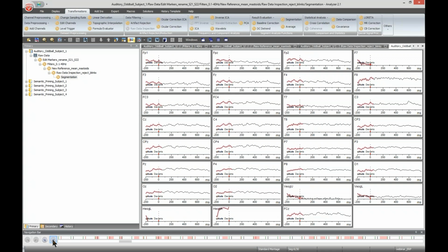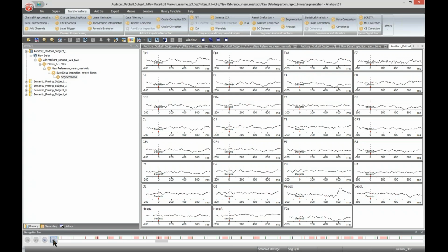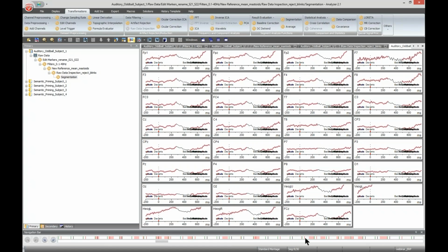You can easily identify that there are segments with bad interval markers, but you can also see that down here, that quite a few of them have that. And when I go through my segments, you can also see the index down here. So now I'm in 9 of 30, so you always know where you are. Segments with these bad intervals can be easily seen, as I said. We kept them for now, but later in the average, they will be automatically discarded because the average doesn't want to take bad interval data into account.